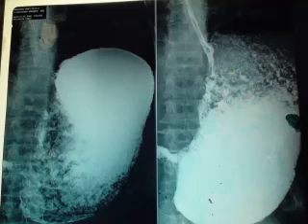Now, this is the first study for the stomach. It's called barium meal. As you see here, the dye is filling the stomach. Here, mostly in erect position, the dye is moving down to the lower part of the stomach, and here in Trendelenburg position with the head down, the dye is filling the fundus of the stomach. As you see here, the stomach is hugely dilated. So, as we agreed before, huge dilatation of an organ is with a benign disease. It's not a malignant disease.